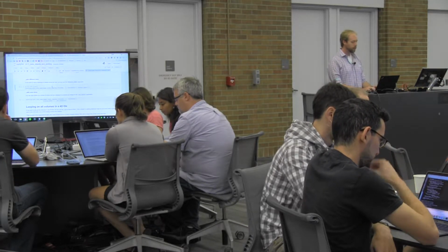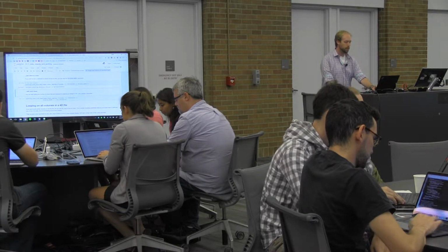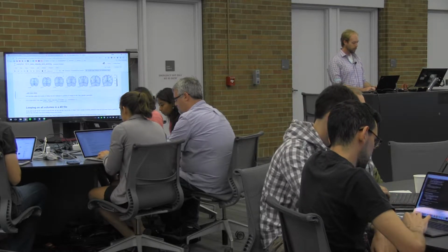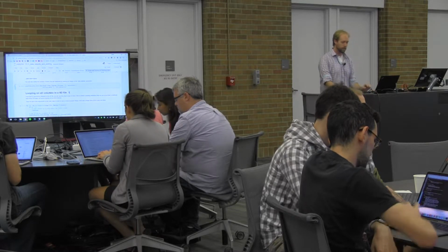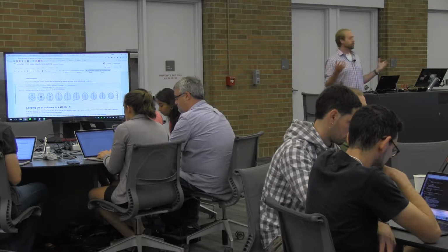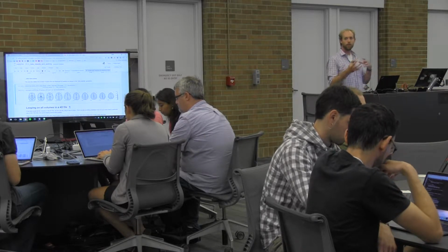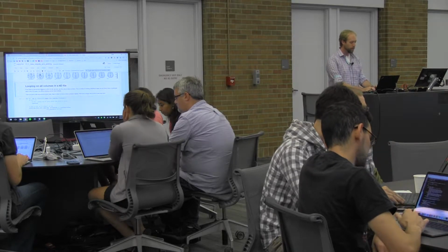You can also change the sorts of views that are available when you make the plot. If you want to display only a particular orientation of the brain, you can do it like this. If you want to display more slices of the brain, you can do it like this. These are just a couple of examples. Look through the plotting function there and try to get a feel for how you could create the plot that you may want to show in a paper or something like that.